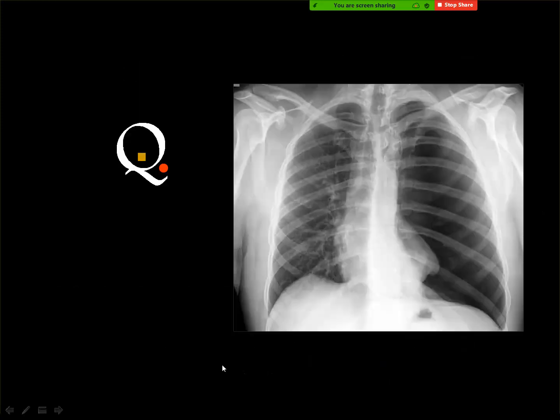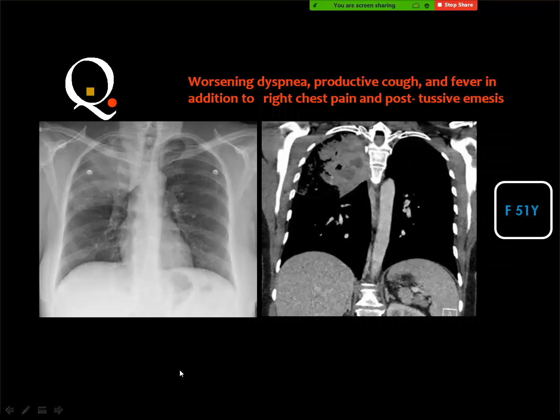Yes. Left-sided pneumothorax. Tension pneumothorax. Tension or simple? Tension. I don't think that this is tension, because you know that the left copula is lower than the right copula, and this is usual. And the heart is almost in the central part of the mediastinum. Okay.